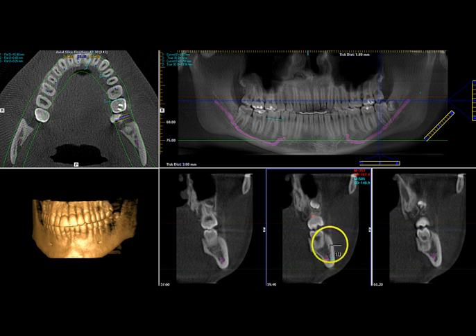So you can see even within the cortical bone, even though you can take an x-ray and you can see, hey, I have about, measure the distance, about 5.47 of great cortical bone, but it's great. Even the strength is pretty good, but the quality is different from the interior of the mandible.